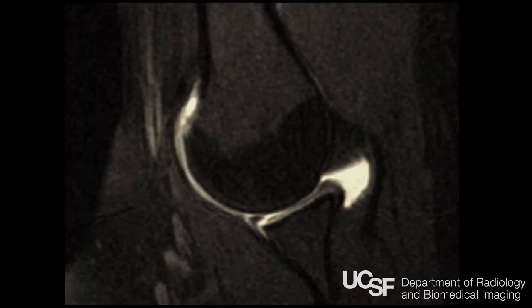And often you'll do a CT scan to quantify how big it is, because that will help the surgeons decide what kind of surgery they're going to be doing to fix it. Bankart. Sometimes the Bankart lesion is not bone, sometimes it's just labrum.